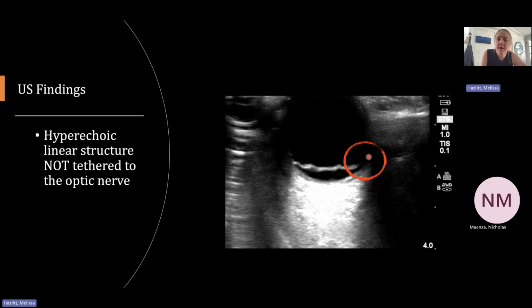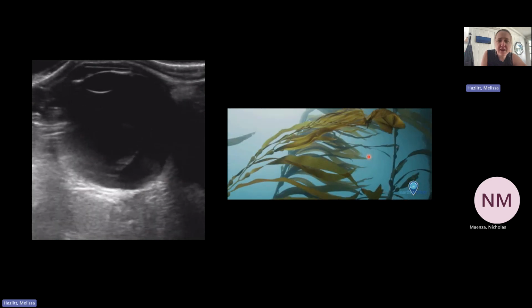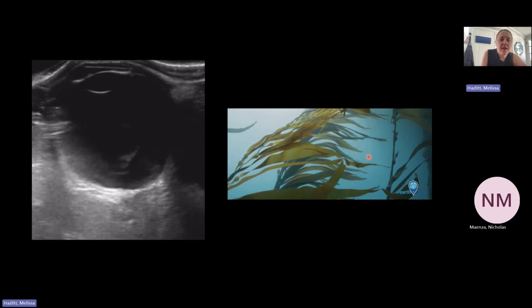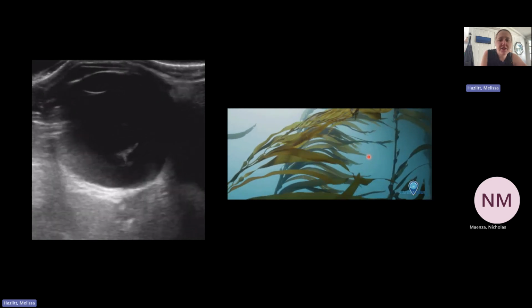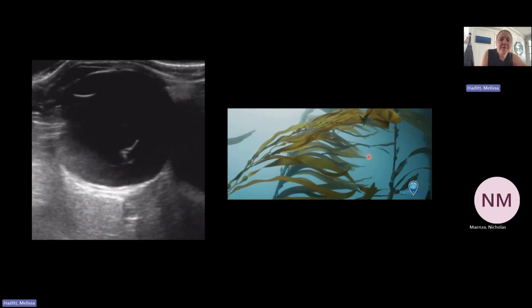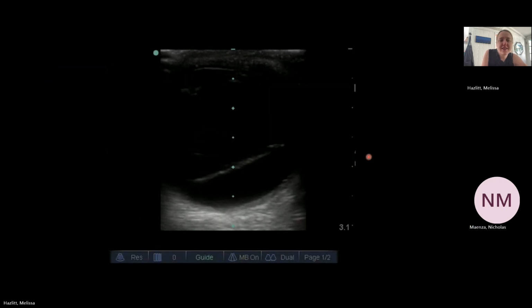So they all exist on a spectrum of horror. You can also see, I've seen the description of this as a sea kelp sign, which it actually does look like, beautiful sea kelp just floating. We can just stay on the screen for the rest of the lecture just because it's so relaxing. It's very soothing. This one's a glitchy form of what we were just looking at.